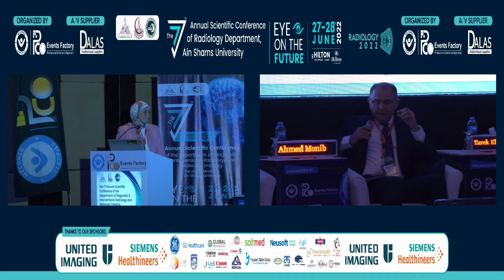بالنسبة للماسل إنفيجن احنا في الديفيوجن والتي 2 ويتد إيمج. لو الديفيوجن ستادي proved ان هو invading the muscle layer of the urinary bladder wall will go with the diffusion in spite of ان التي 2 مش مبينة.